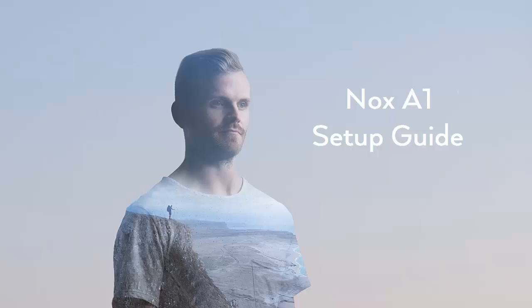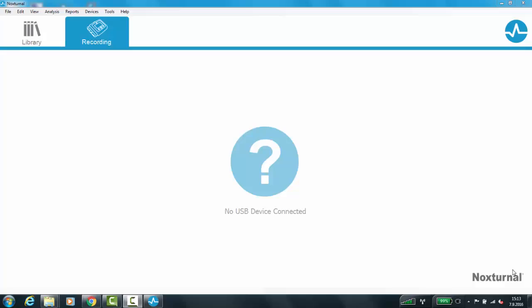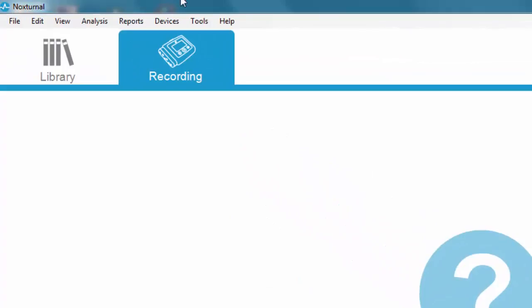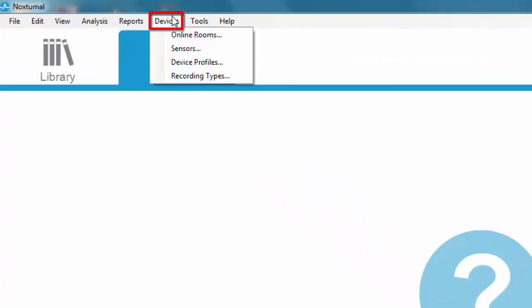Welcome to this Nox Medical tutorial on how to set up online and ambulatory recordings using the Nox A1. The first step is to create an online room. Navigate to Devices and Online Rooms.